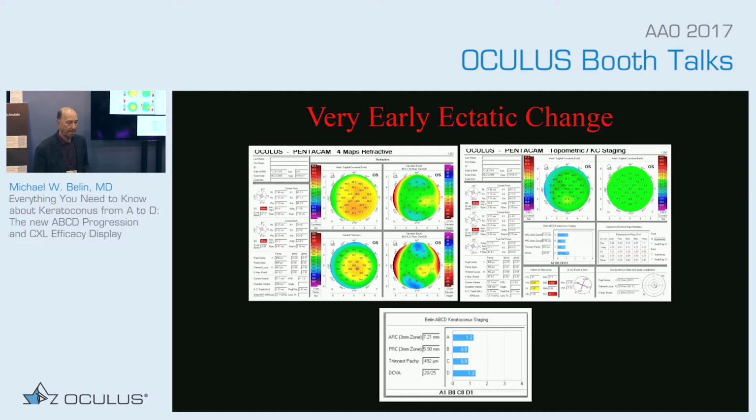So this one shows that the anterior and the vision is going, which is some of those later lines, but the posterior is normal. Well, the posterior is normal within the staging range. It's not normal. That's different. Don't confuse. That's the back elevation. It doesn't reach the next. That's why, as I said, this accurately describes. This is just putting you in a classification. Right. Yes, and this is literally right on the edge.